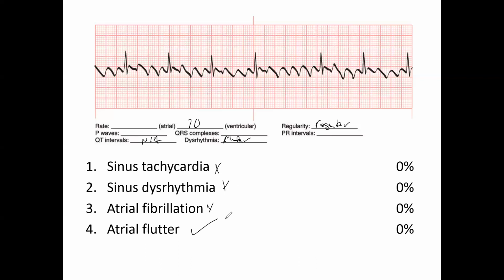And atrial flutter gives you a sawtooth pattern. So if you happen to see that, then that's what you'll be looking for on your ECG rhythm recognition exam.